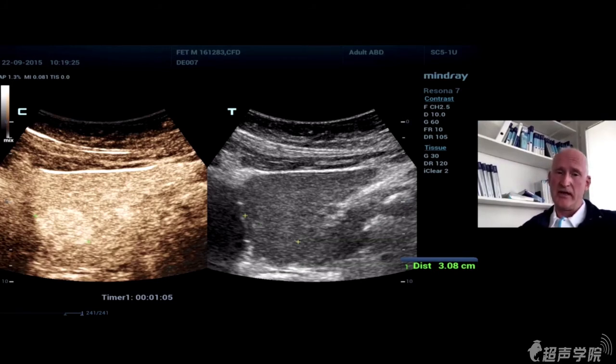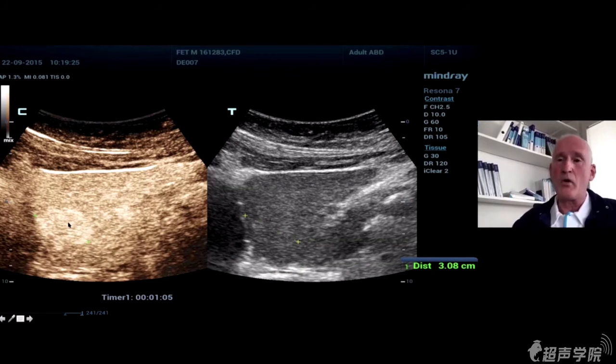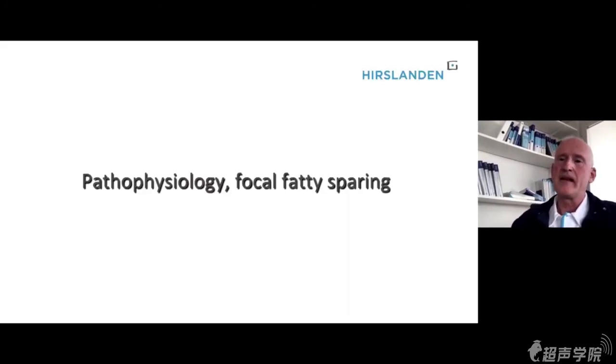But regularly, FNH contains atypical portal vein branches, and they are hyper-enhancing in all phases, also in the portal venous and late phase.